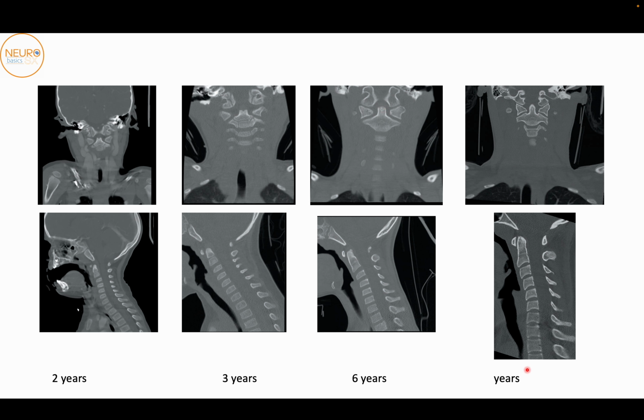This is actually at 10 years. So at 10 years, you can see now the apical dens center has also fused over here.